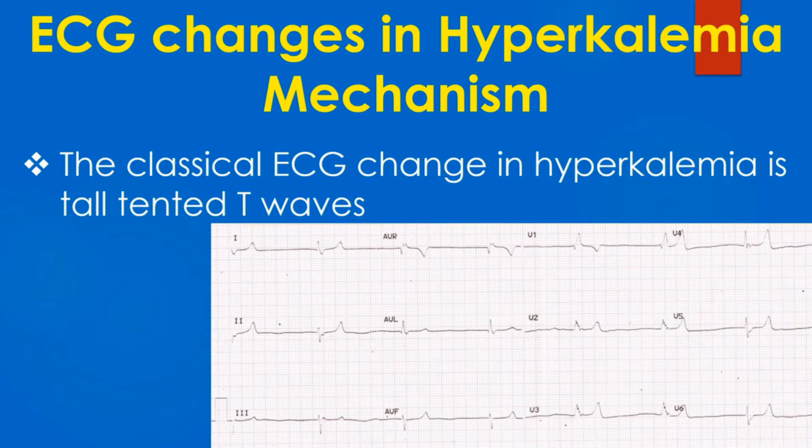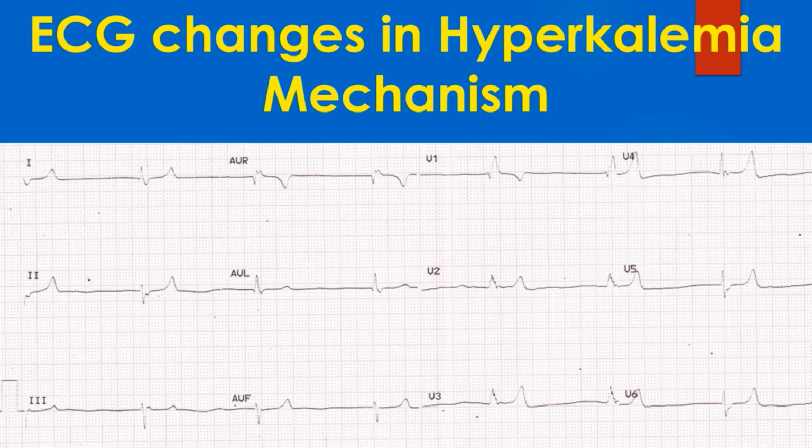1. Tall T waves. T waves in anterior leads are as tall or taller than the QRS complexes, though the absolute amplitudes are not very high. 2. QRS widening with right bundle branch block-like pattern. 3. Lack of atrial electrical activity. No P waves are visible and there is bradycardia. It could very well be a slow junctional rhythm.